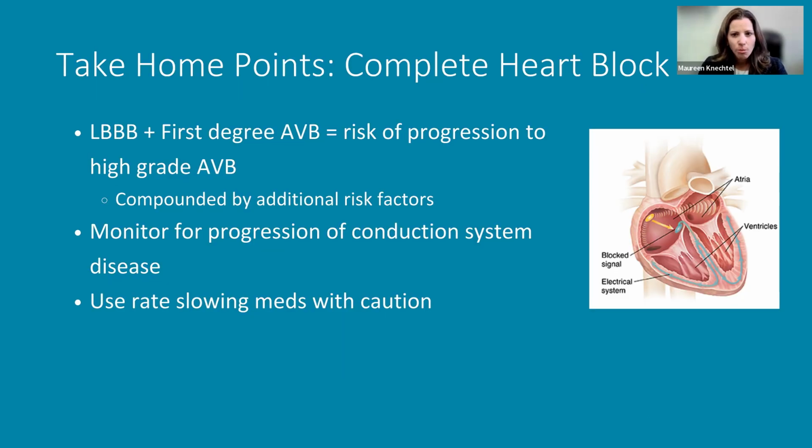So let's look at a couple take-home points from complete heart block, in addition to what we already talked about. Being able to recognize AV dissociation is the most important thing. The slower the heart rate, the lower in the conduction system the focus is coming from, and that means the patient is potentially more unstable because everything above that in the conduction system has failed.